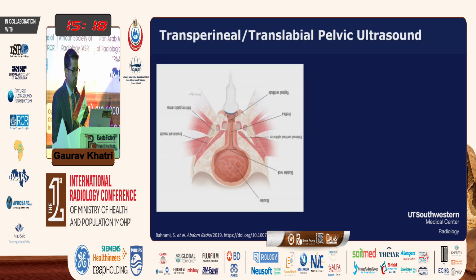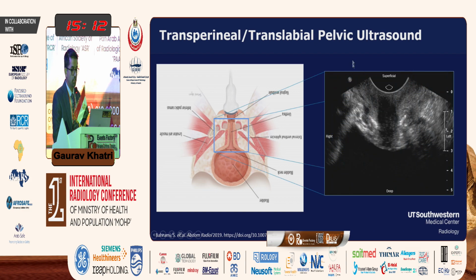How about on the transverse plane? So again, we're focusing on just this small part of the anatomy, and if we blow it up, here is the urethra and this is the bladder there. So again, that's the anatomy you need to be aware of for the transperineal ultrasound.